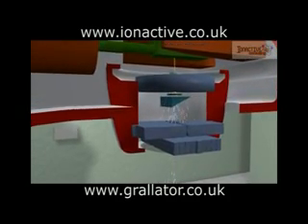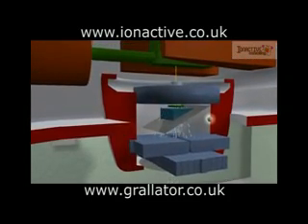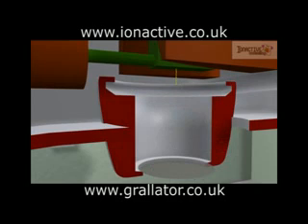The treatment head also typically includes a beam monitor for control and feedback purposes and a lamp and mirror to aid with target alignment. The treatment head can be modified in multipurpose devices so that the electron beam itself is delivered rather than X-rays. In this configuration, one or more thin scattering foils are used to broaden the electron beam to give a uniform dose over the defined area.